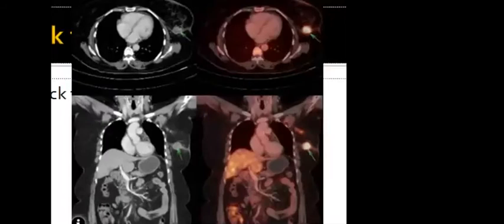If you add PET-CT for the staging or the restaging, it could help. Also here, sometimes this lesion could be missed in the interpretation of the CT, but in the PET-CT it will be easy for you to detect. So for example, if he missed all this and you just say that he has a left breast lesion, you will give him, for example, T2, N0, M0. So he will be like stage 2 probably, but after you find these liver lesions, he becomes stage 4. So the PET-CT upgrades the staging. I mean, if you miss such lesions in the CT, you will give him M0.